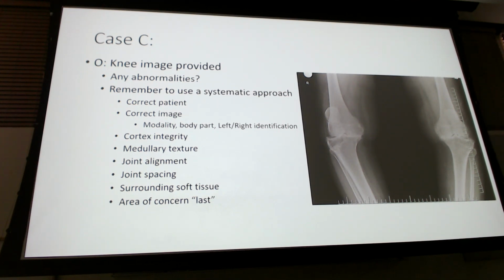Try to find, sorry, I know you all are like, this is osteoarthritis. I already know this, right? But what I want you to do with this one is see if you can remember. Just looking at it and going, osteoarthritis, great, moving on. I want to see if you can remember and recall all the little things that are the signs of osteoarthritis in this image. There was a list of little things we went over and covered. Go through it, see if you can find them, so that you're not just relying on history. You can go through the X-ray and be able to pull this stuff out. I'll give you about a minute or so to take a look at it.